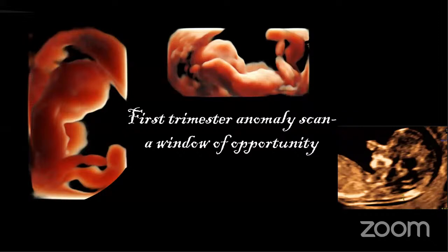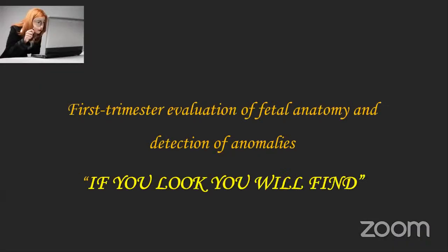Usually we do an anomaly scan at 18 to 22 weeks, and it's been going on for decades. But now we know that with advances in technical skill and ultrasound technology, as well as our understanding of embryology, we can now assess the fetal anatomy in greater detail right in the first trimester. Although the first trimester scan cannot replace a second trimester anomaly scan, it can be of much use in assessing the anatomy from head to toe. So my tagline is, if you look, you will find.